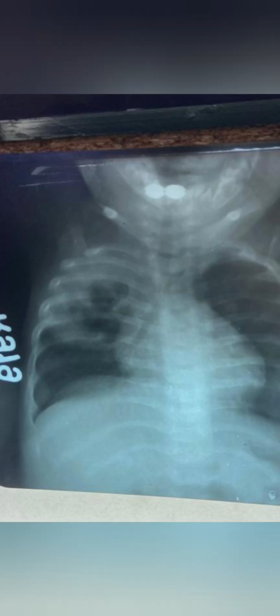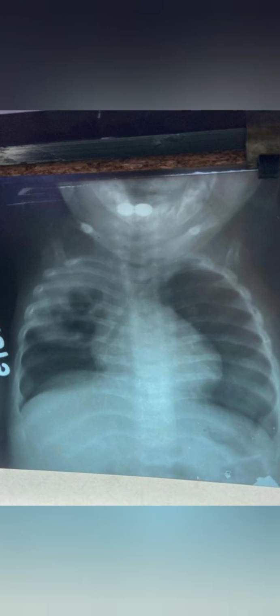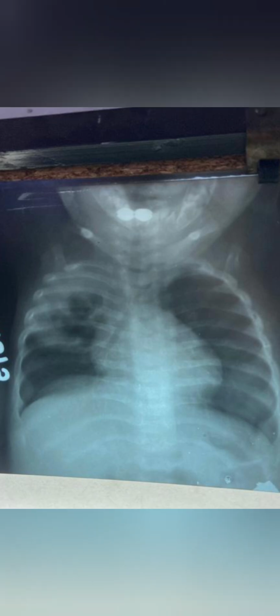You shouldn't directly jump to the diagnosis. First you should see that this is just a radiograph of a child. Mention about the heart borders, then you should mention about the lungs, that on the left side the lung is clear, but on the right side there is an air cavity which could be seen in the middle lobe of the lung. So this could be probably a case of pneumatocele.